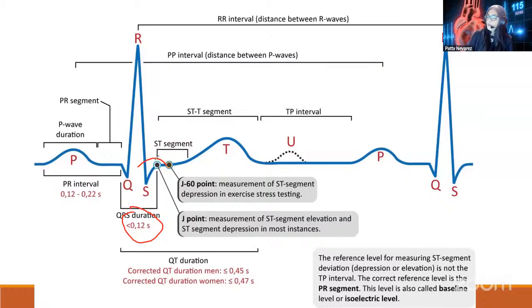And then we have some other information like the J point. That's important to know. The ST segment is extremely important, especially when we are trying to see STEMIs, or ST elevation myocardial infarctions. That's what STEMI stands for.